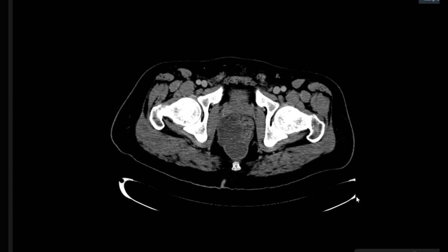Yes, sir. So, sir, my first impression is that it may likely be a perirectal abscess. No, don't tell me from the start. This is what you see, then summarize. When you have the findings and you put the summary, it is easy for you to put the differential diagnosis.